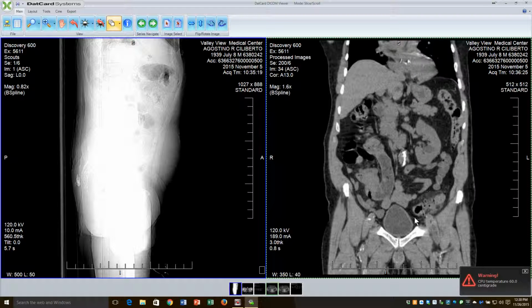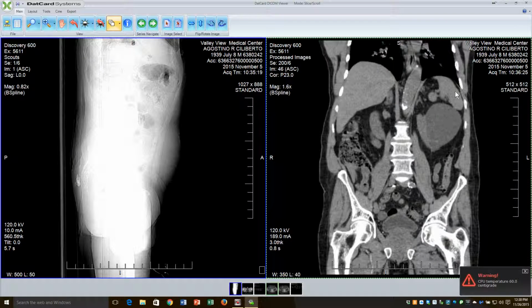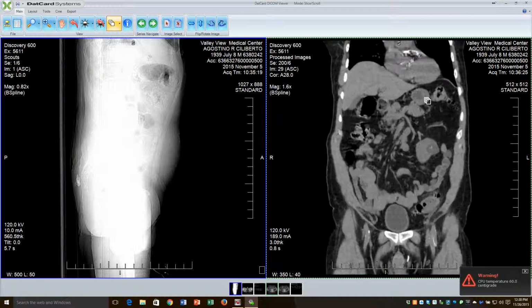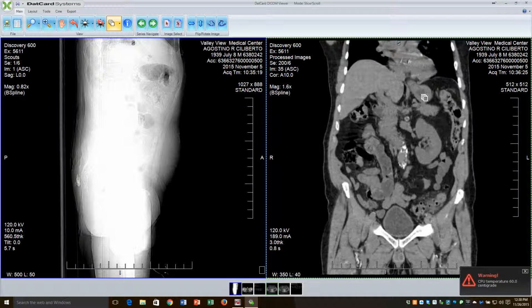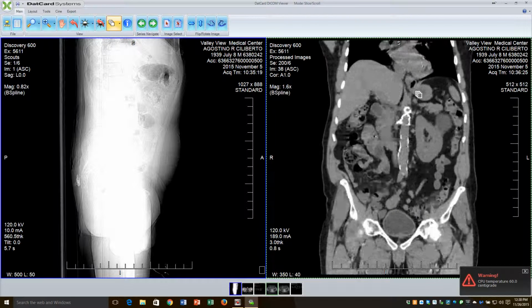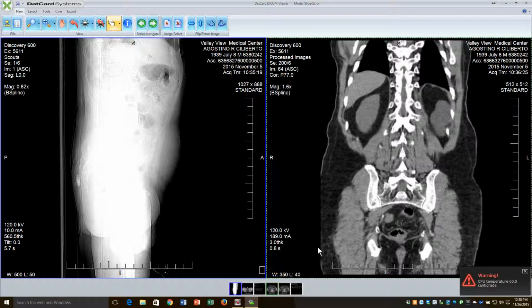It's not that bad. On a scale of 1 to 10, I would say that this is about a 5. Giant cyst in the kidney, spleen. And here is a small hiatal hernia, so you might have a little reflux disease from this. This is where the esophagus is entering into the stomach right there. So let's take a look at another set of images.